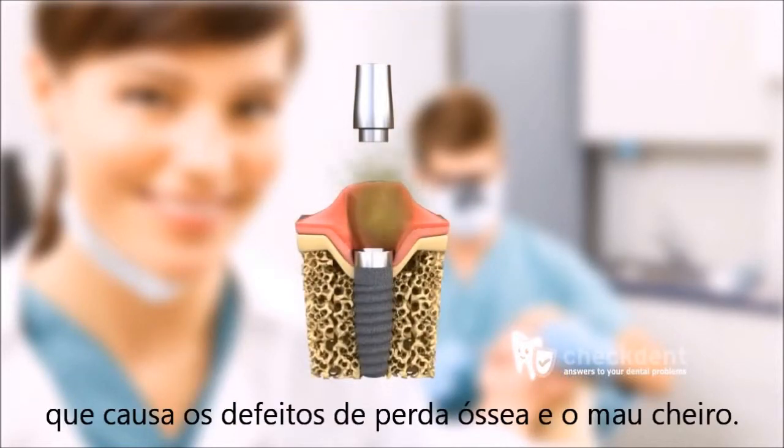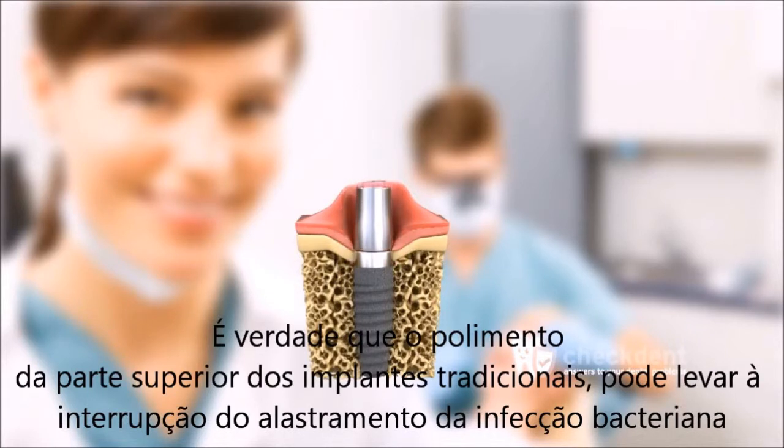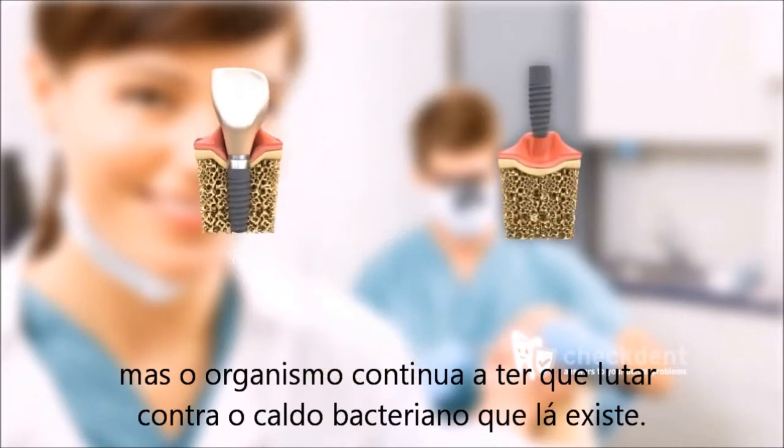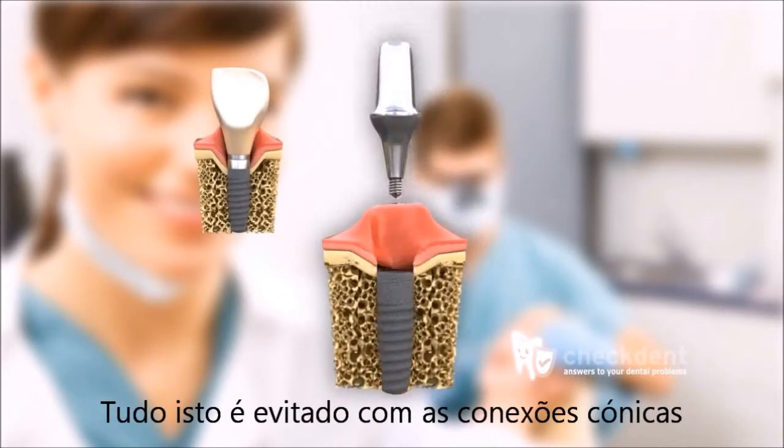By polishing the upper part of the implants with plug-in connections, it's true that the spread of bacteria can be interrupted, but the body will still have to fight the bacterial soup that exists there. All this is avoided with conical connections.